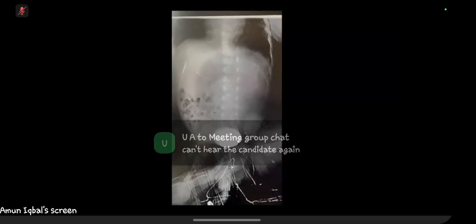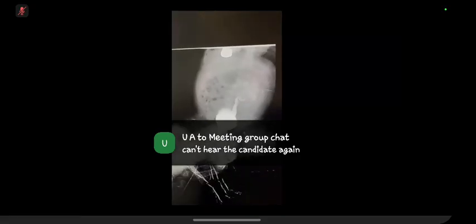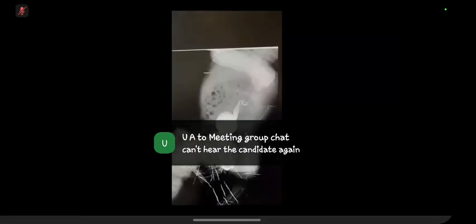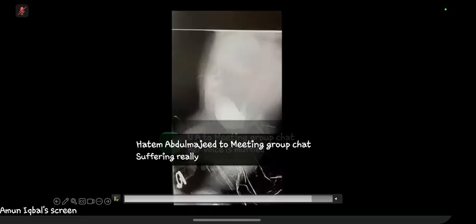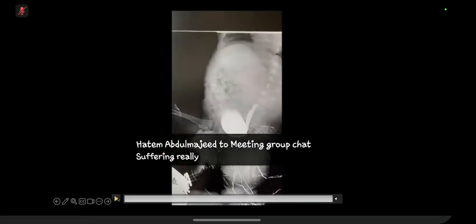Yeah. This is the side view of cystography in a 2-month-old with a history of recurrent urinary tract infections. I can see that there is a catheter in the urethra with contrast being injected inside the urinary bladder. So I think this is a micturating cystourethrogram. Upon injection, the contrast passes into the lower part of the left ureter, which appears to be dilated, and the right ureter was not outlined with contrast. So here I'm suspecting left-sided vesicoureteric reflux.